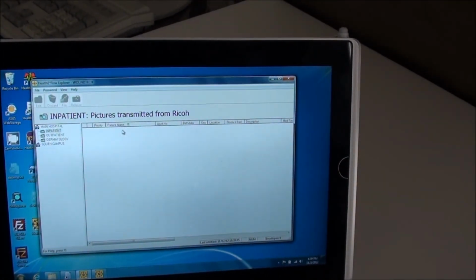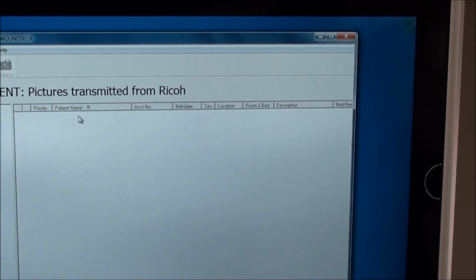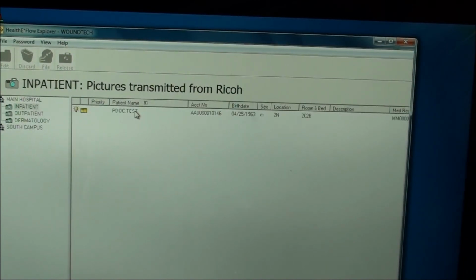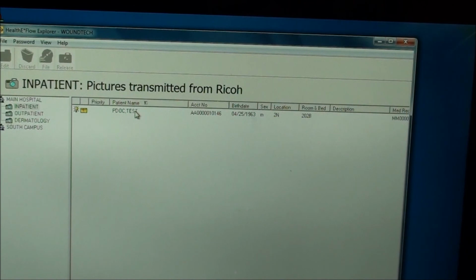process. Here, the picture account number data is extracted, the patient looked up in a census table fed by HL7, and then placed in the proper HealthE Pix work list based on the patient location for the proper resource to process next. In this case, the main inpatient work list.